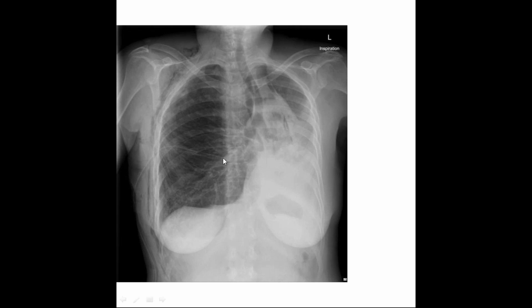It's not entirely a drain. This must be an ECG lead. This is the anomaly that I wanted you guys to pick up. This is most likely an ECG lead.